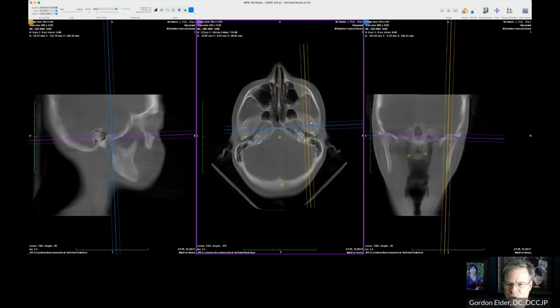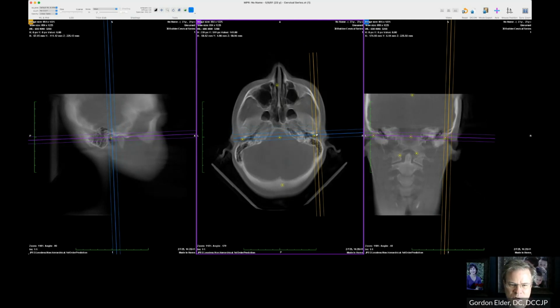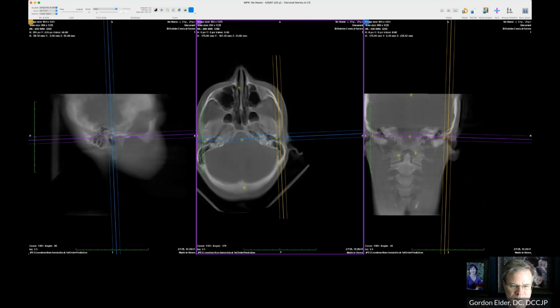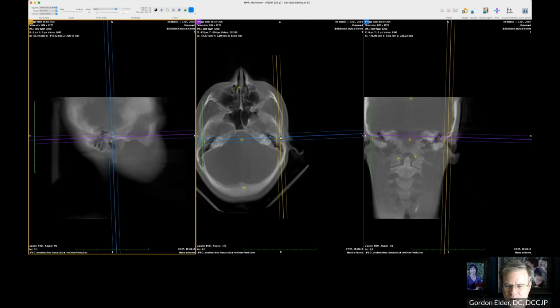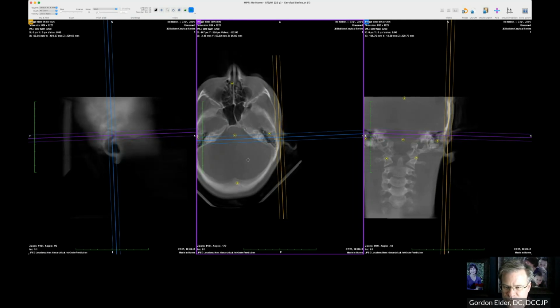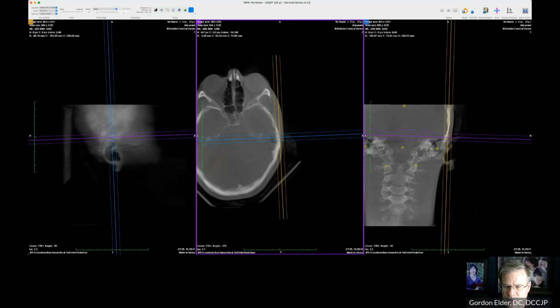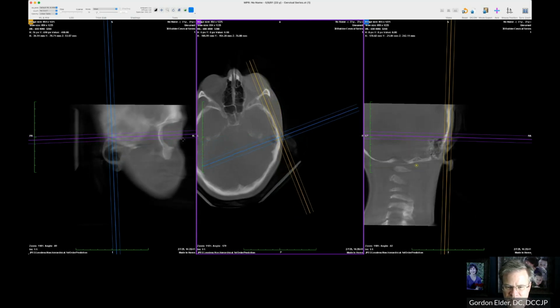We are going to come up here. All right, there's the top. Top of the ear. We're going to come up. Good. All right. Top of the ear. Top of the ear. We can look over here. And I'm going to rotate this in. You can see the eyeball up there at the top of the screen. And you can see here's the eyelid come down to about right there. So I am going to angle.